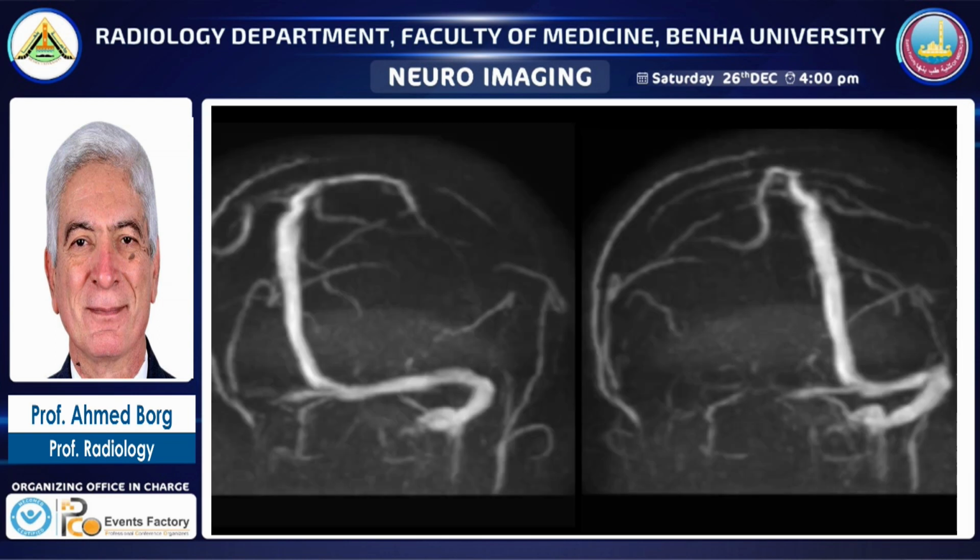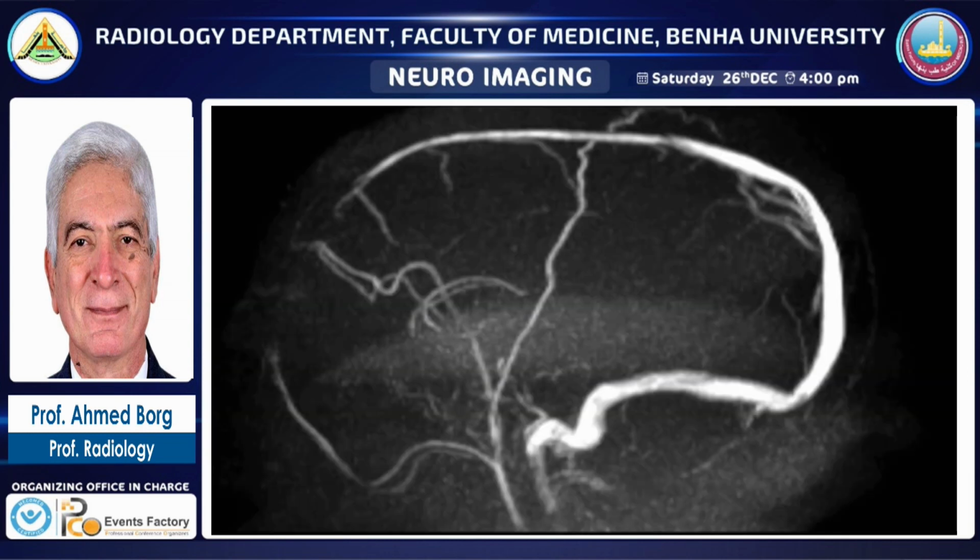This is the MRV. There's no transverse sinus flow signal, so it is occluded.